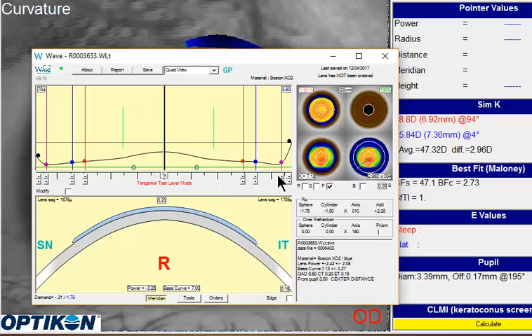You'll now see this lens as it's viewed from the tangential approach. So in other words, it's looking more closely at the peripheral corneal data and relating with how that axial design may look at that. And if you notice, you've got some downturning areas in this peripheral lens, so it suggests that you might be getting a little bit of what I refer to as the cookie cutter fit here. So we want to improve this alignment here.